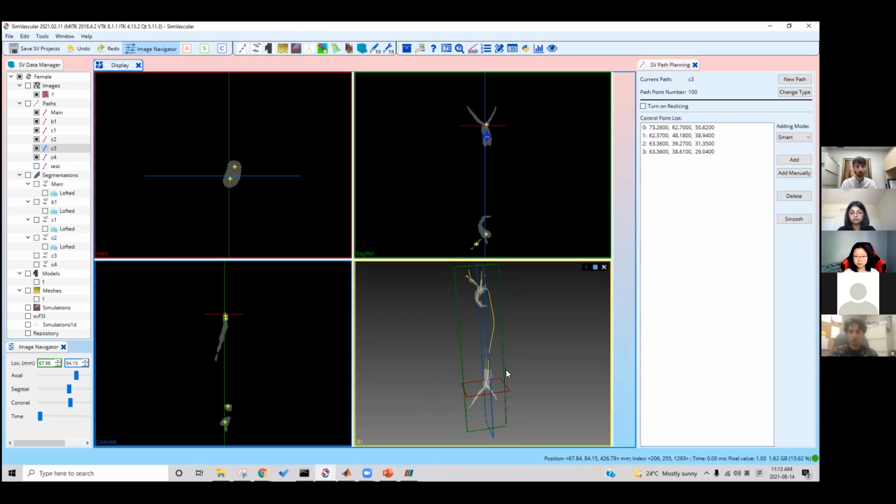So as you can see, all this is done by hand. So obviously, a human has a limit to how centered you can be on the images, but that's okay because these center lines are only there to act as a helping step for the next one, which is our segmentation step. So as long as it's around in the middle, it'll be fine. So I'll show you guys what we do with the center line. This is to me the coolest part of this software.